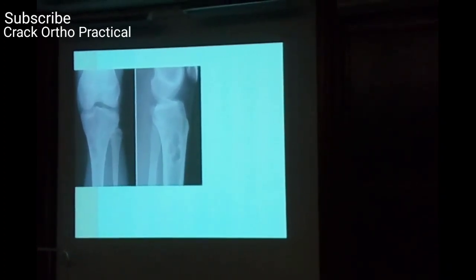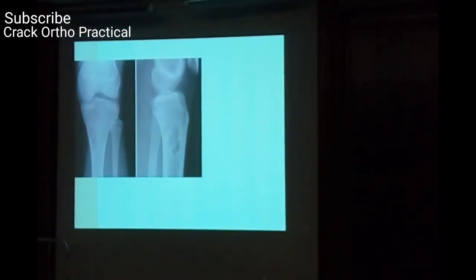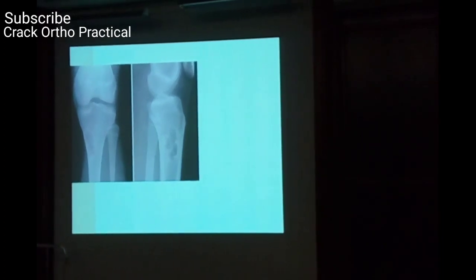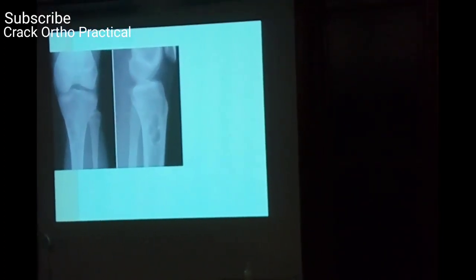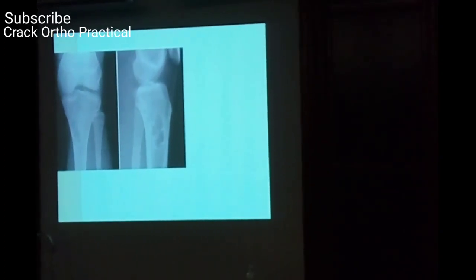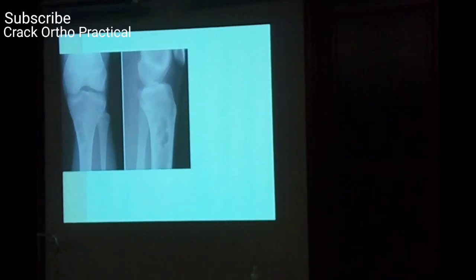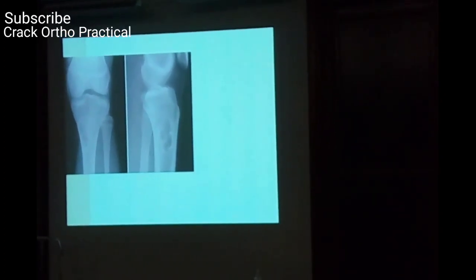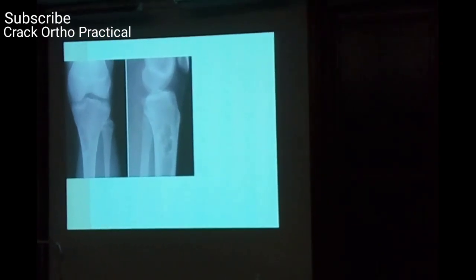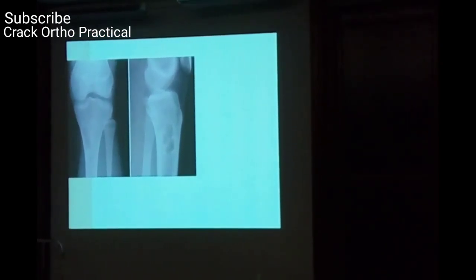X-ray of the knee showing distal femur, proximal tibia and fibula, in anteroposterior view, an eccentrically placed lytic lesion in the metaphysis. And in the lateral view it is centrally placed. What does that mean? With a narrow zone of transition. In one view, if you say it is eccentric. It's eccentric, sir.